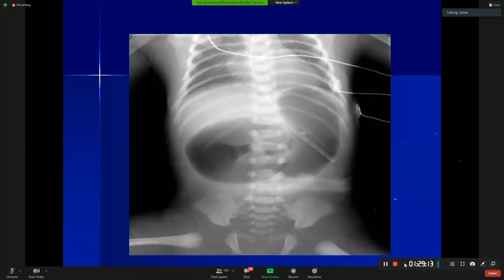And this is one of the newborns that was born with abdominal distension, and a thoracoabdominal radiograph was done showing this appearance. Sir, this is the X-ray abdomen, frontal projection of a skeletally immature patient, in which I can see a large lucent gas-filled gut loop involving the left upper quadrant, traversing downward towards the right mid quadrant.